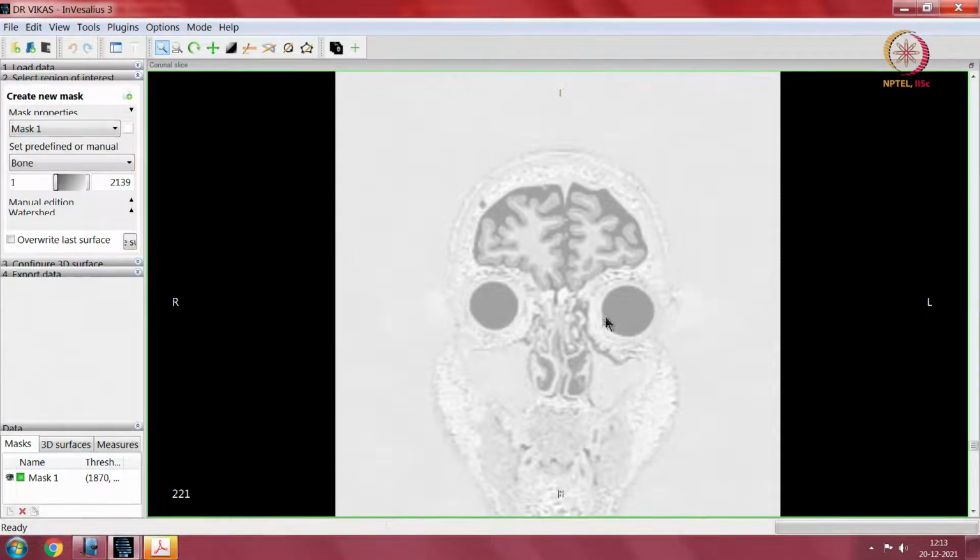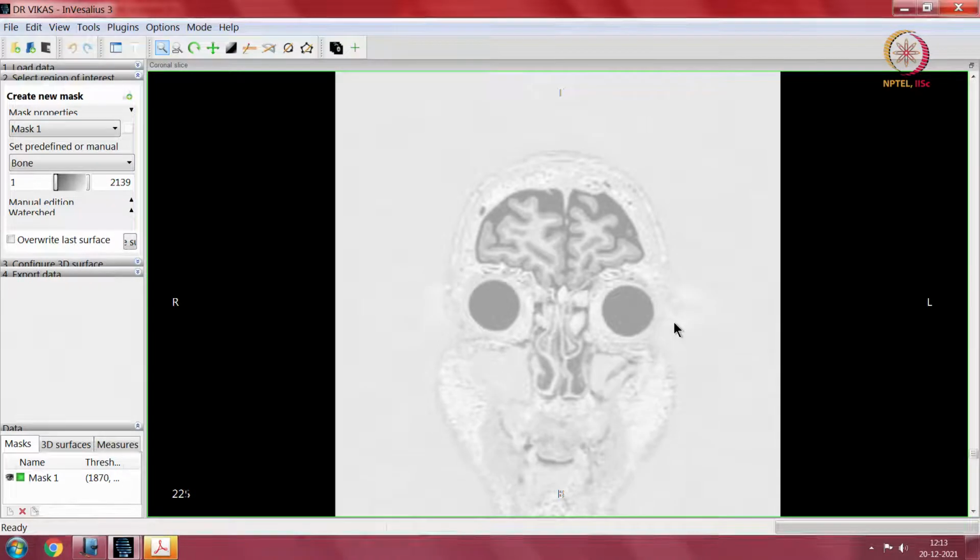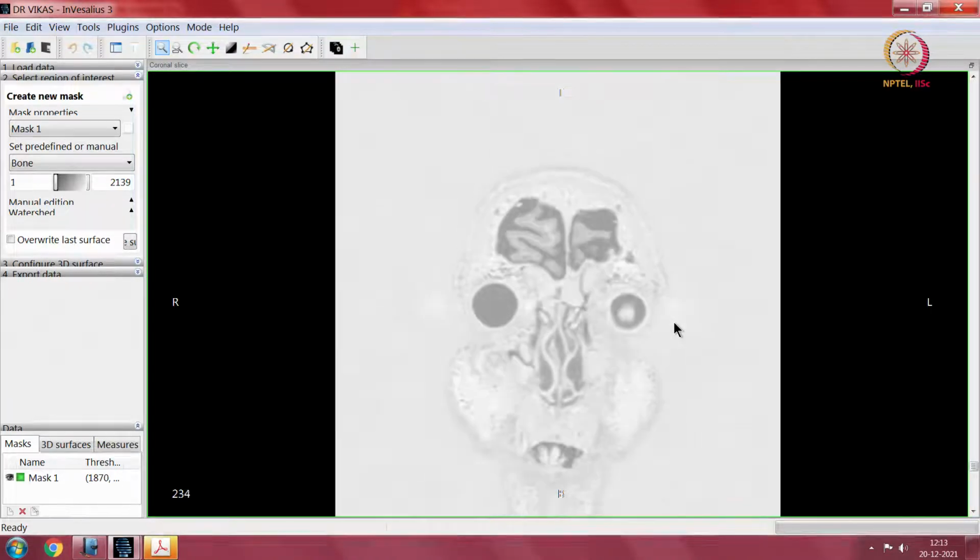So, this is eye and nose, and you should always interpret images as if the person is looking towards you. So, when the person is looking towards you, this is the left eye, right eye, and that is how it is. Okay. So, these are conventions, there is no hard and fast rule. In fact, you saw me flip through the image a couple of minutes back. So, that is how it is.